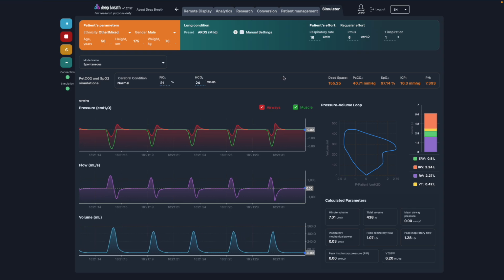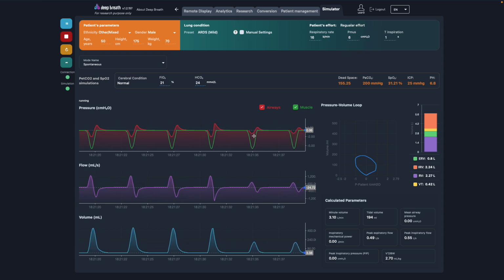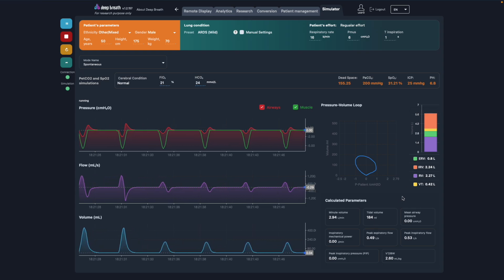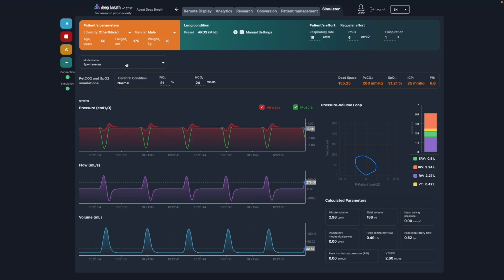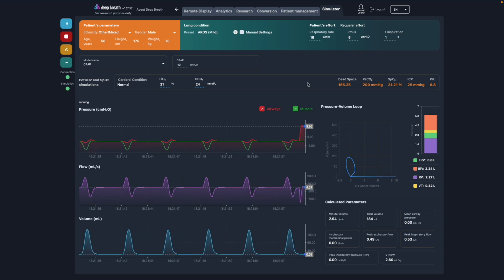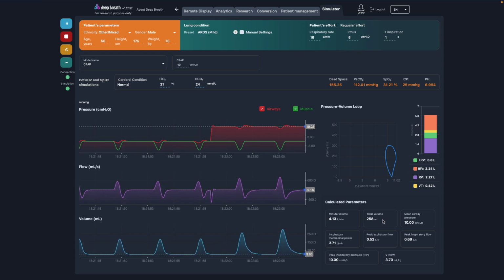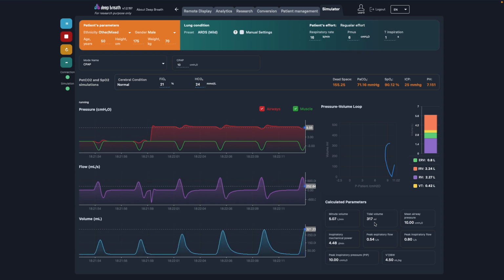Update. With the same effort, we see airway flow and airway pressure much less, and tidal volume much less. So this is something that we need to fix. The pH level is very low, and for example, we should use CPAP, for example, this. So it will increase a little bit. Yeah, so we see tidal volume increased, so recruitment is much better now, but still not enough.